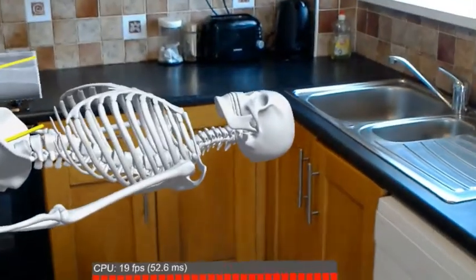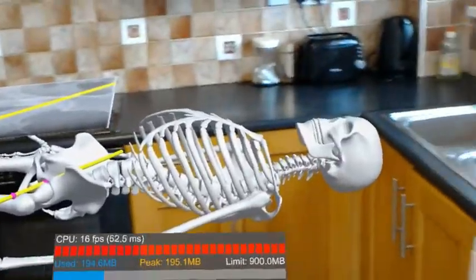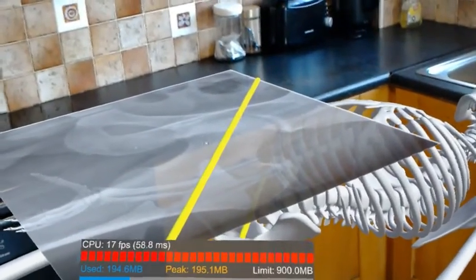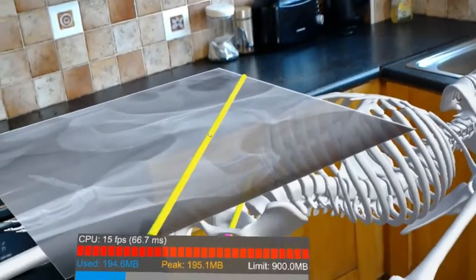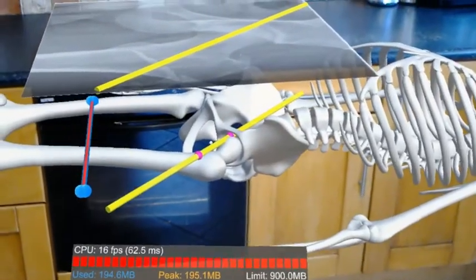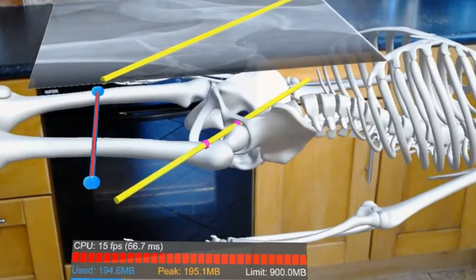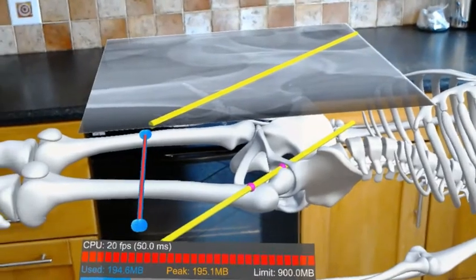So, as you can see here, we have a 3D skeleton representing the human anatomy, or the human body, or the patient if you were. And we have the X-ray here along the top, representing the patient's hip with the 135-degree line lying across the socket of the joint. And this line here is essentially the pilot line on the patient, which is essentially a copy of the original line here, with the addition of these two pink dots, which are the entry point and the exit point going into the patient's hip.